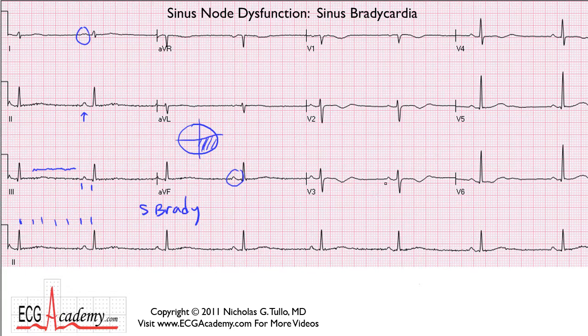If you look at the precordial leads, you can see easily that the PR interval is clearly in the normal range, here about 180 milliseconds. But the other interesting thing is that you can see an ST segment and a T wave, but this large bump right there, and in fact you can see it nicely in V4, is a wave that follows the T wave, and it's known as a U wave.